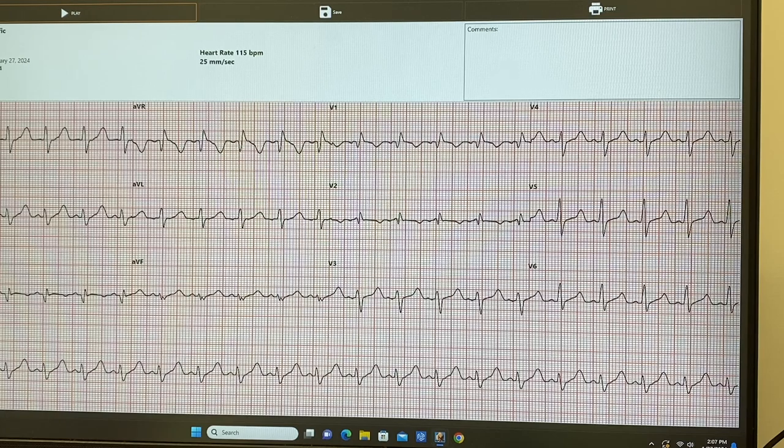Okay, so this is my P, that's your R, and that's your T. Do we have an inverted ST segment here? No, sorry. Don't jump to conclusions. First, we know we have a regular rhythm. That's good. Now we're looking at the rate. You identified your R's, so now do your R to R.